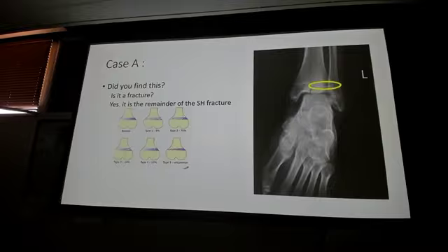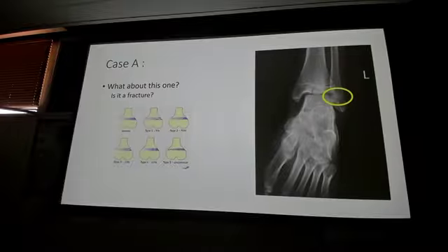If it's in the epiphysis or the metaphysis and involves the physis, we assume the fracture is also in that area, but you can't distinguish between the growth plate and the fracture, right? So technically, that is part of the fracture, because the Salter-Harris 3 isn't just this, it's this and through the rest of the growth plate. Does that make sense? What about that one?